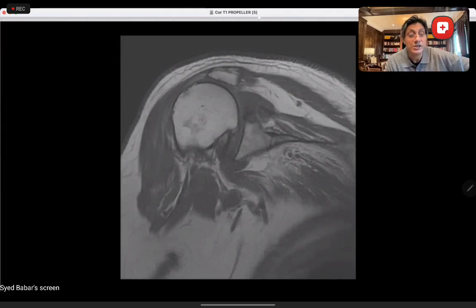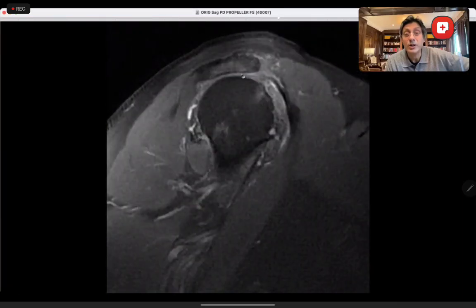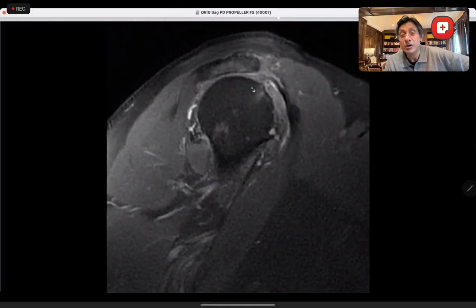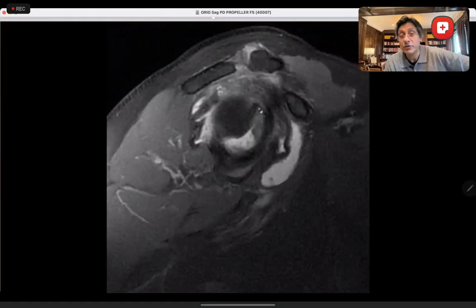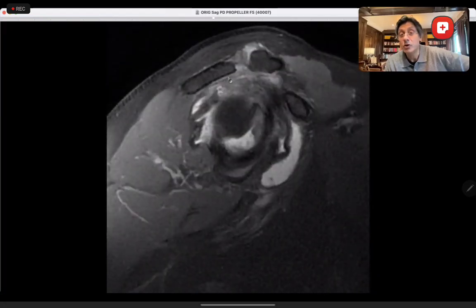It doesn't matter what type it is, because the type is a constant feature. That is congenital, what you're born with. The shape of the acromion is what you're born with. What else happens is the wear and tear. So this shape has got nothing to do with the fact that the patient has got a full thickness tear. The full thickness tear is a wear and tear phenomenon.